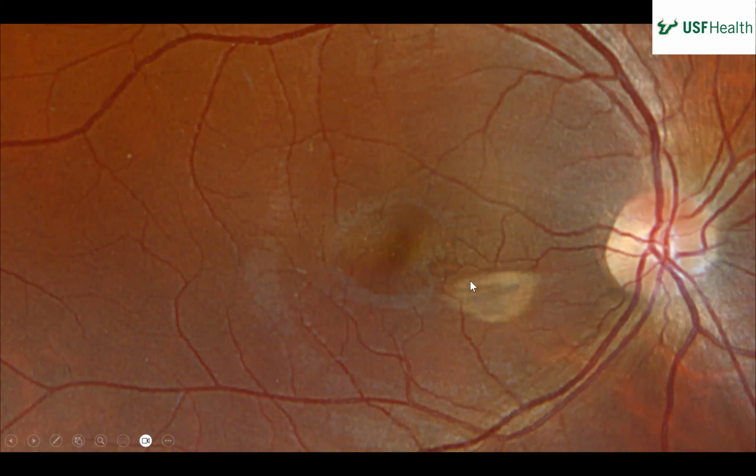And then you can do the shape and size and edges and all that, and color. This didn't quite capture the color. I have to say, it was a little fleshier, less yellowy. It was more kind of fleshy. So it appears to have relatively well-defined borders.